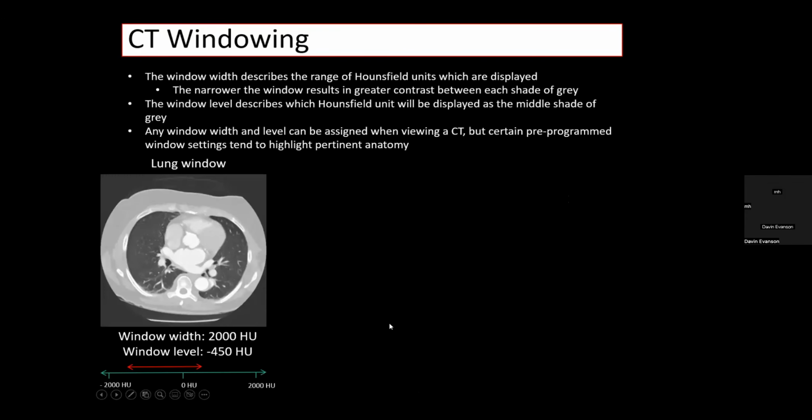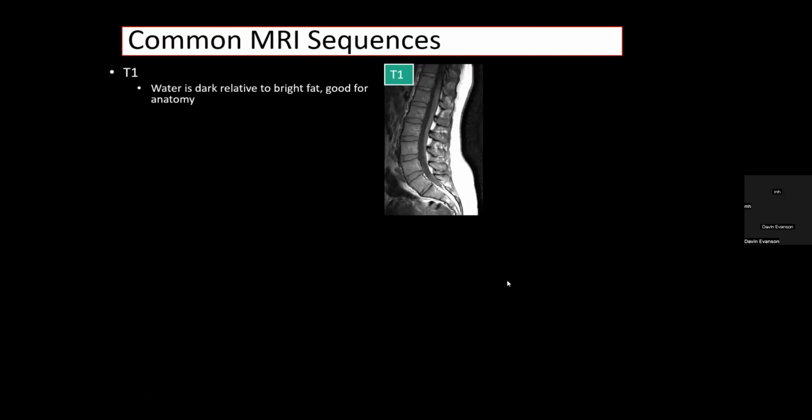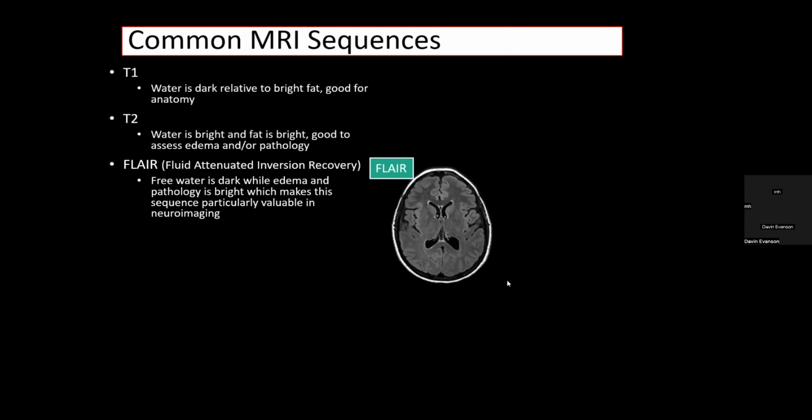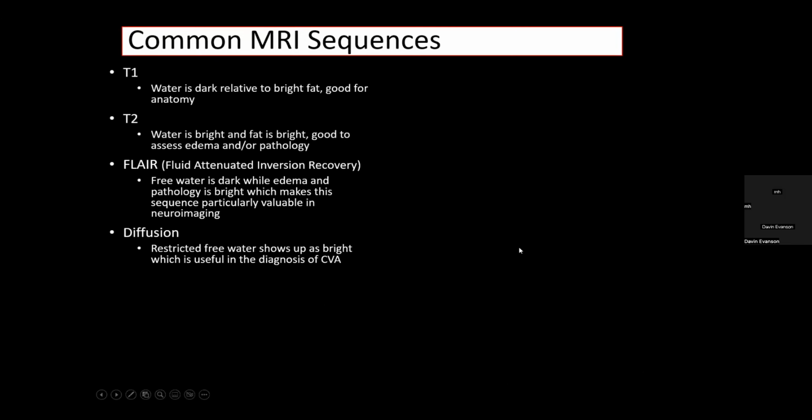And we can use this to our advantage for windowing. If we want to look at the lung detail, soft tissue, or bone detail, just move in the gray scale. Again, we go into much more detail in the other intro videos. Same thing with some of the MR sequences, being able to tell T1 from T2, some of the special sequences.